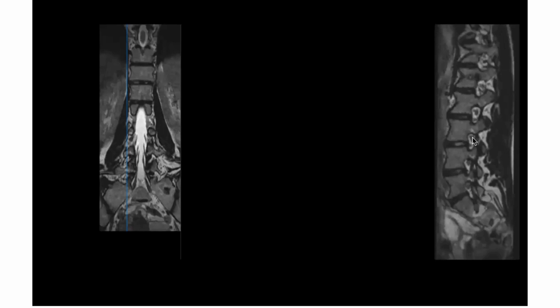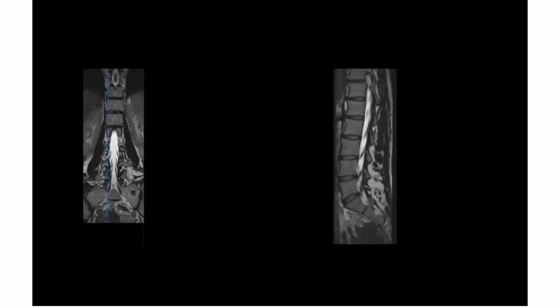Now, as we go medially, this exiting root will come out of the foramen, and what we see is the traversing root. You can see here, the traversing roots are coming out of the dural sac. So you're talking with respect to the lower disc? To this disc. Let's say this is your L3, L4. So which nerve root is this?